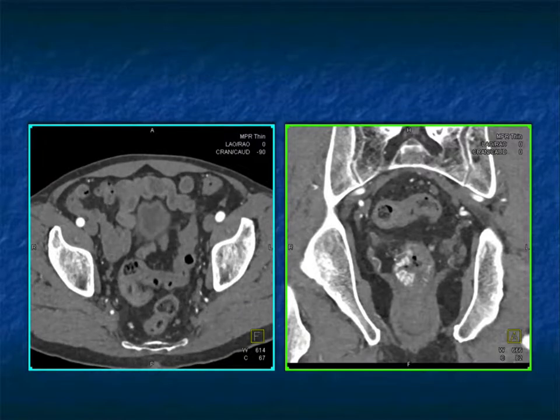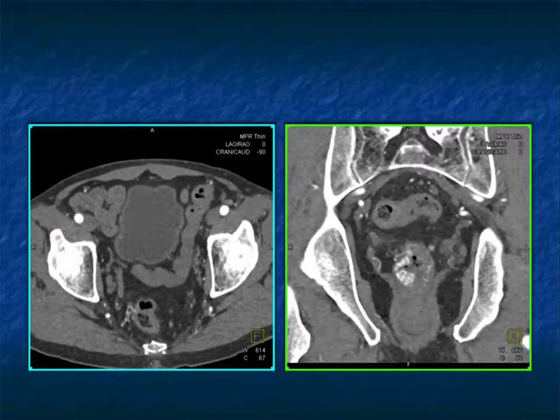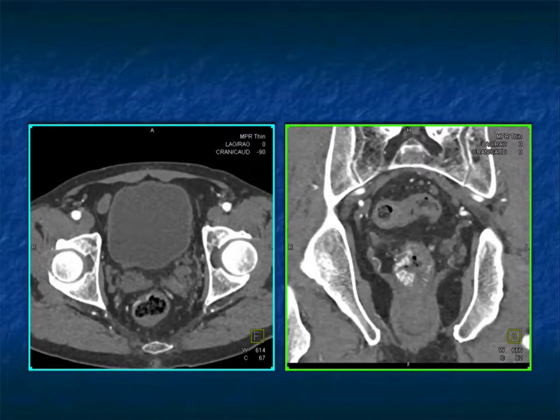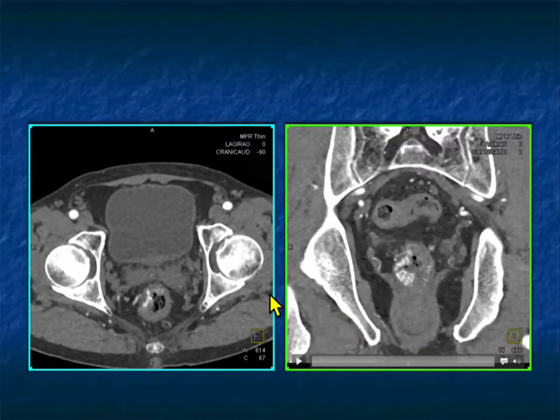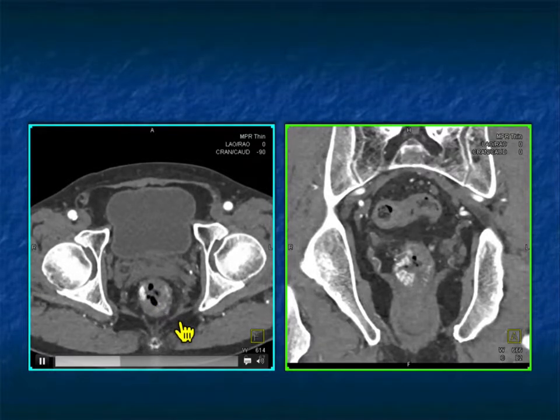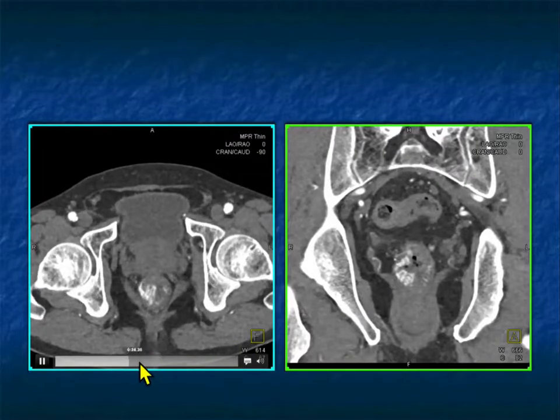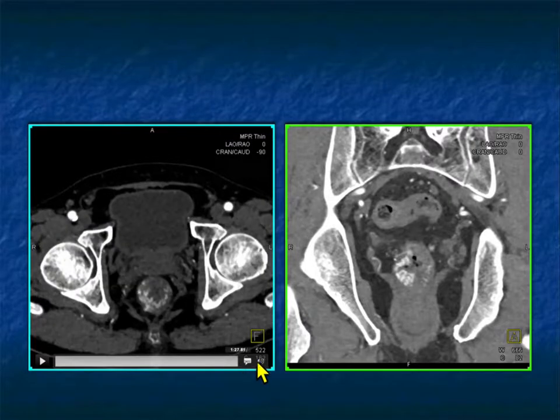And as you scan down toward the patient's rectum, you then come into the multiple varices that are present, very nicely shown. You can see it's coming in right now. It's eccentric. There's the vessel feeding into it. That's the bright enhancement, beautifully shown. And you could see it as well when you get to the coronal view. But again, a very nice way of looking at the patient's colon.